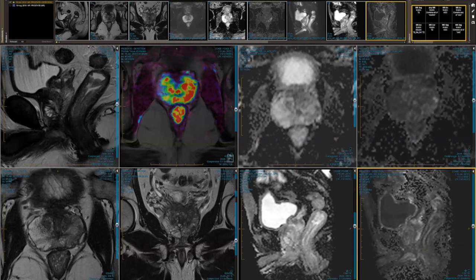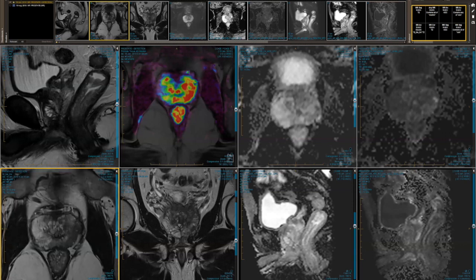Claire, a question for you regarding extraprostatic extension. This is obviously a pretty decent lesion that we're dealing with here. In your experience, how well does the appearance of extraprostatic extension on MRI correlate with reality, or what we see on histology? When we're confident that we can see it, then we're usually right. The problem is that the pathologists can get down to 1 to 2 cells, and we're never going to see that. So, can we see all of the extraprostatic extension? Absolutely not. And we'll never be able to see the microscopic.